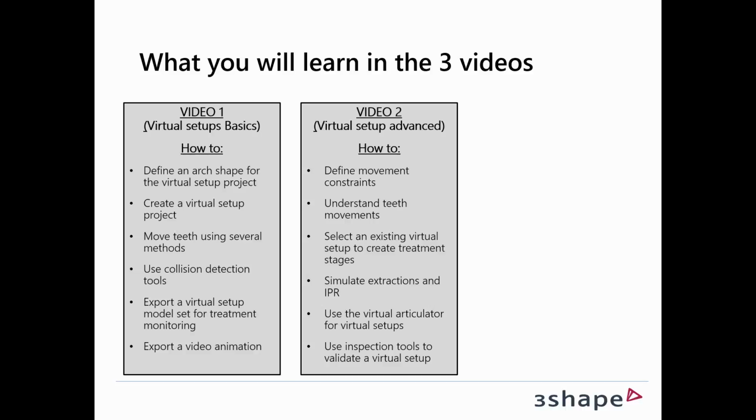The second video, which is more advanced use, will teach you how to define moving constraints, how to understand teeth movements, and how to select an existing virtual setup to create treatment stages, and also how to simulate extractions and IPRs we discussed before. It will also teach you how to use the virtual articulator for virtual setups, and finally to use the inspection tool to validate a virtual setup.